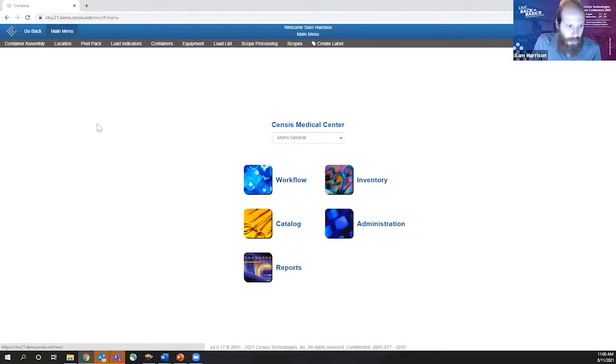All right, before we break for the day, I'm going to do a very quick recap of everything that we did without all the extra detail. We started the day off by creating a new HLD device group and a new HLD device. So I'm going to do that right now. Let's say that I have a brand new HLD device here in my department. I'm going to walk through that without me talking as much, to show you that it can go quick. It's just that I threw in a lot of detail.